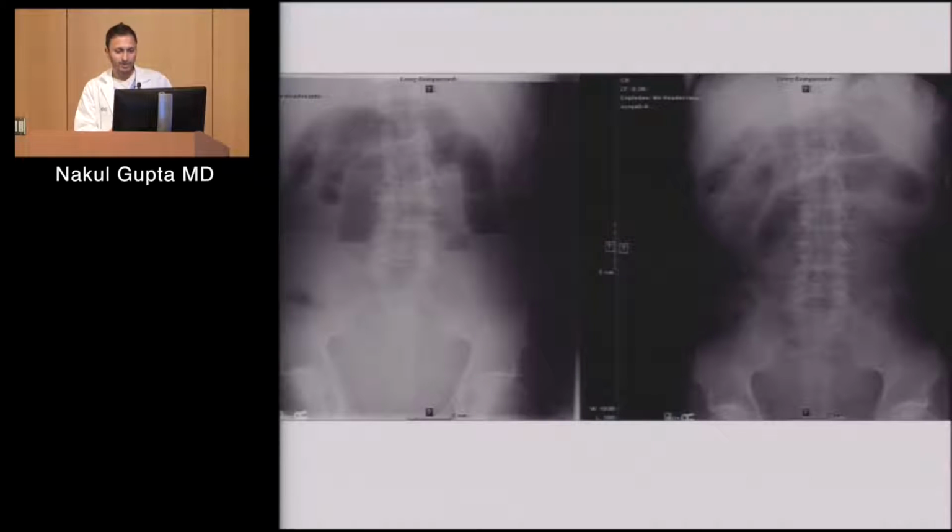We typically allow up to 3 centimeters or so caliber small bowel before we say this is frankly dilated. Without a ruler, I can look at these and tell you these look dilated. And anytime you have dilated small bowel, you're concerned for either an obstruction or an ileus. If you see these air fluid levels on the upright view, not entirely specific, but suggestive of maybe an obstruction. Typically, you like to see more differential air fluid levels, where you have maybe one fluid level here, a different level higher up or lower down. But that can be suggestive of obstruction as well. So let's continue on.